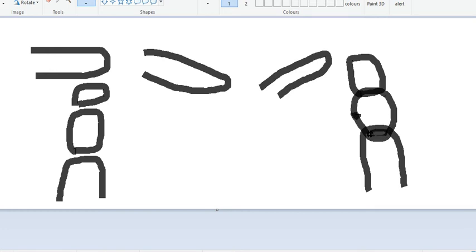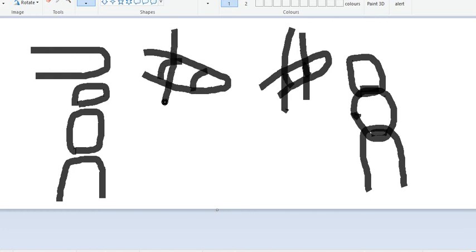We can't clearly see through these joint spaces because the bones are overlapping each other in these planes, because this is the direction of our primary beam. We're not going to see through the joint space at all, and ultimately we're unable to accurately assess the cortex of each individual bone.